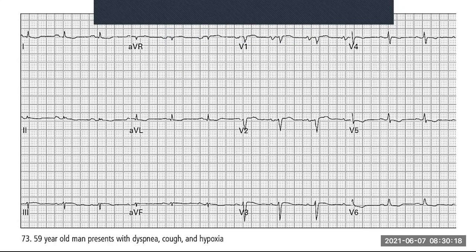What are you going to do? Because it doesn't look like a normal ECG, agree? Something just looks a bit weird over there. So the question you're going to ask ourselves is, what looks weird? Because now before the patient goes to ICU to get treated for a severe pneumonia, what if we are missing out something else? So that's what we're going to be looking at.